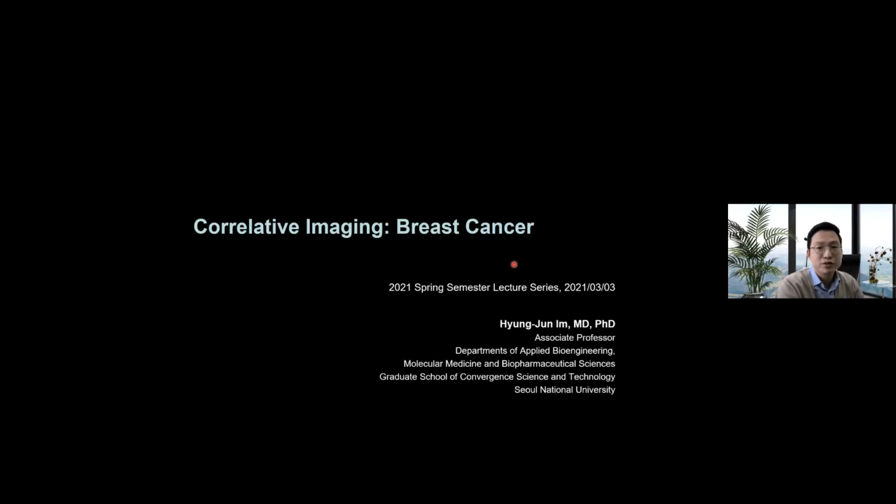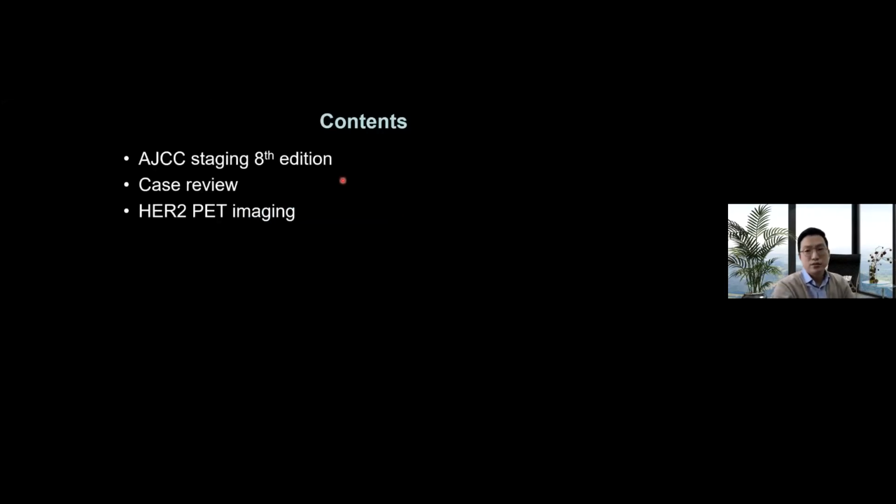So today I'm going to talk about the correlative imaging in breast cancer. So the content will include, as usual, AJCC staging in 8th edition and some FDG PET/CT case reviews.